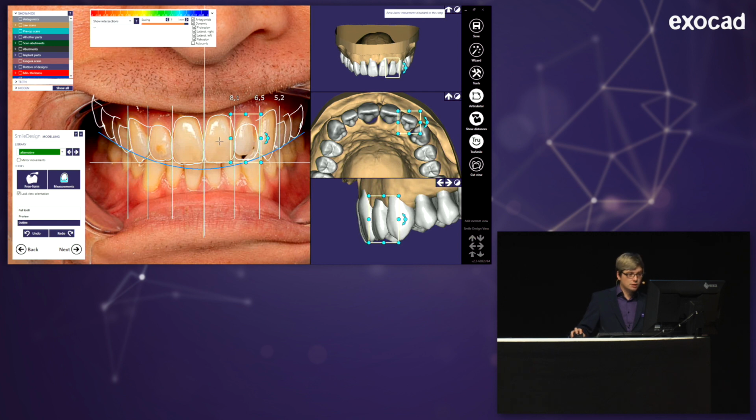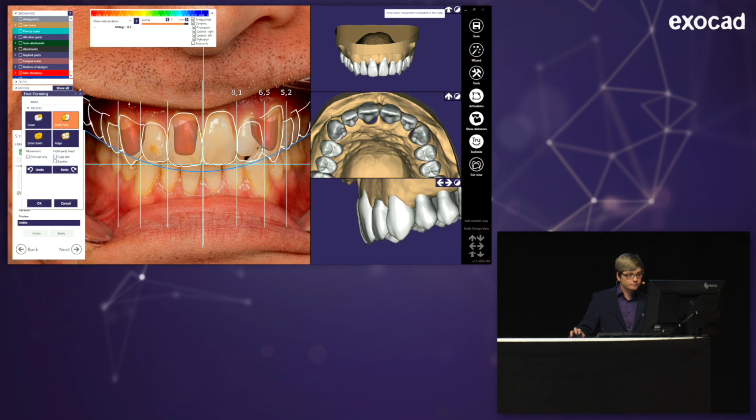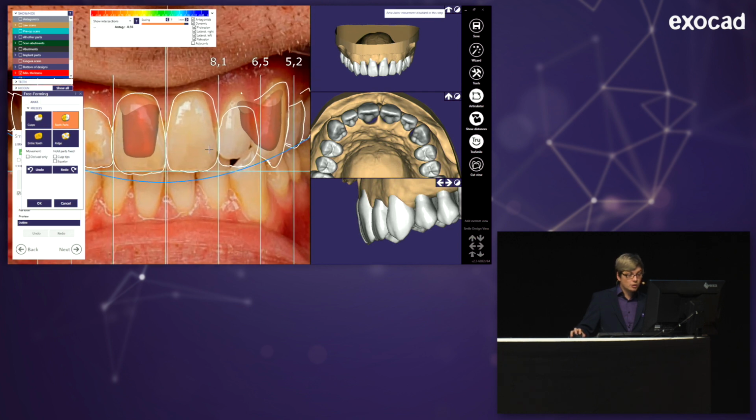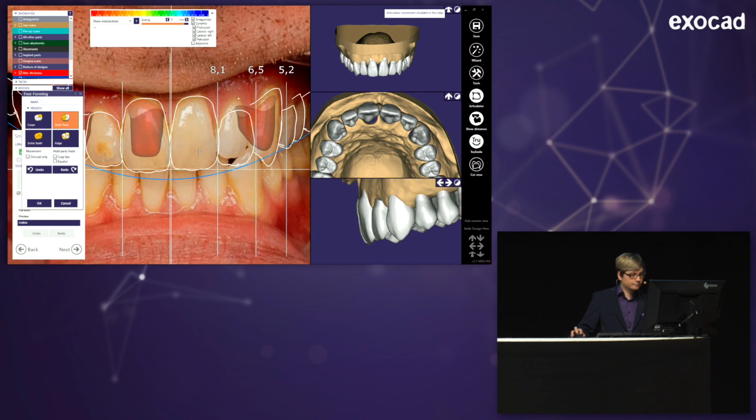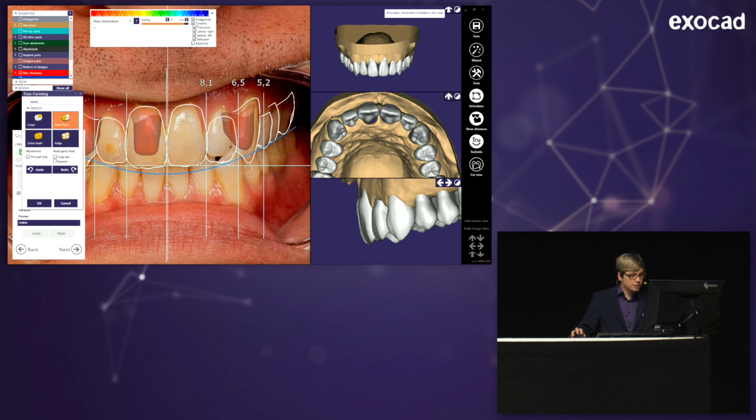And I'm going to freeform it a little bit. I have the option to freeform here, and it's just a normal freeform. It just looks different because of the outline, you see. But it works the right way. And if you look over here at the 3D view, you can actually see the freeforming happening live. So I'm just pulling those two in. Now I'm, I think, pretty close to the original outline.